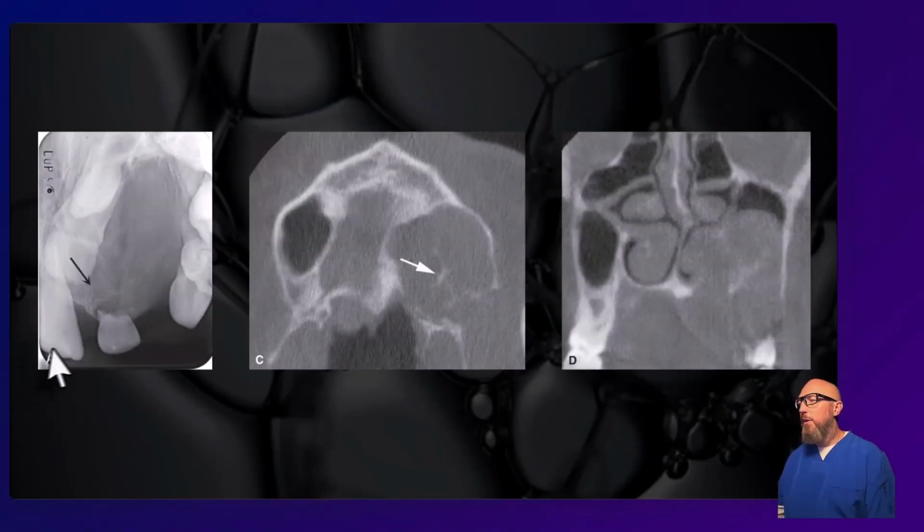All right, so what do you notice about these ones? Let's focus on this PA first, the periapical. It looks expansile, maybe hard to recognize the internal structure. It doesn't have that nice, well-defined loculations like we'd like to see for a MACHO lesion, but there are kind of wispy calcifications interiorly. And then also focus on the age. The age, I think, is a big thing that drives differential for this. Age and location, more central. This is more of your CGCG than it is ameloblastoma based on those two things.